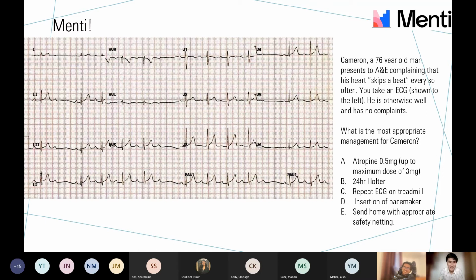Yeah, okay. Your exams aren't for eons. Let's give you 40 seconds. 50 seconds. Okay. Once you've had your answer, I want you to put in the chat what you think you can see in the ECG. What's the pattern that we've got here?